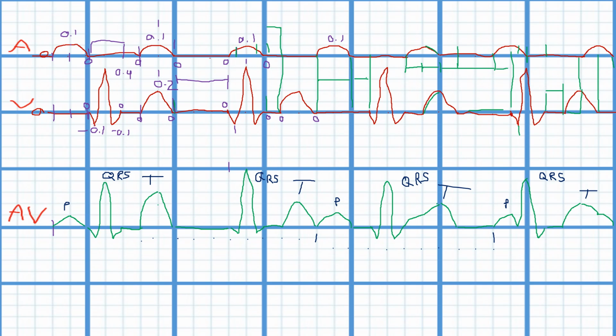So right here, so 10, so this would be 14, 15, 16, 17. All right, I'm sorry, I can't count, but yeah, that's going to be 20. Anyway, so we've got 20 right here. So that'd be off the page right there. But let's see what you've got. So we'll put a question mark P right here. We'll put a P question mark.